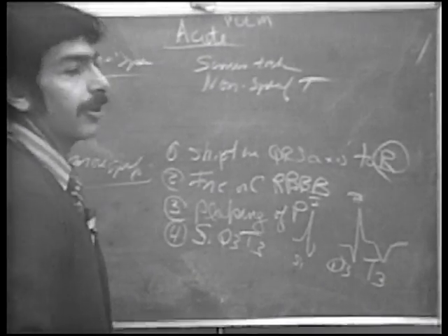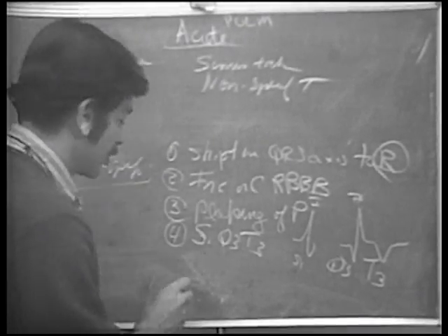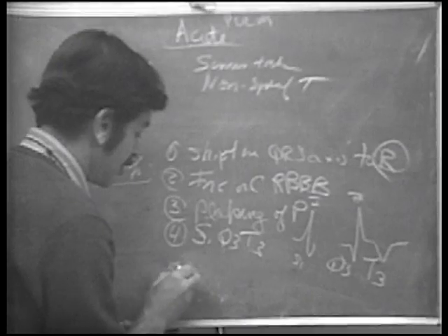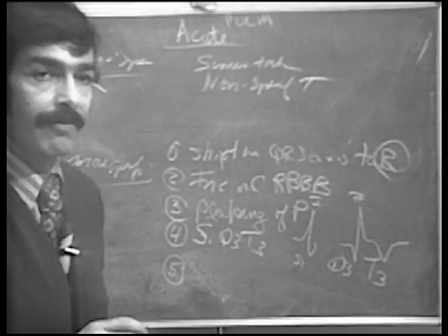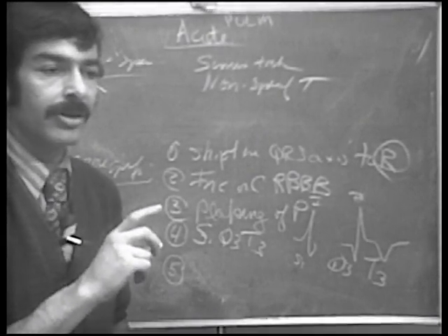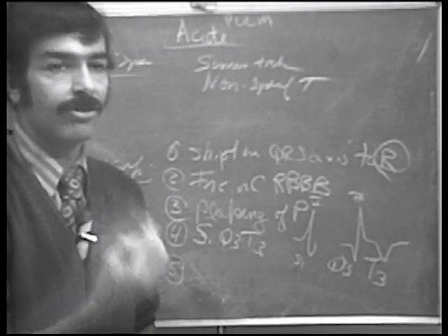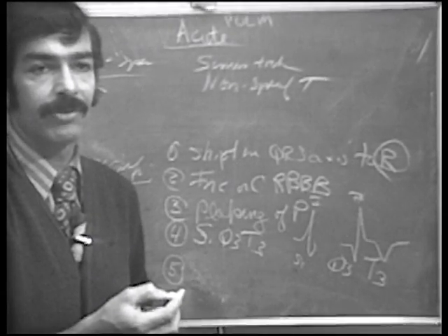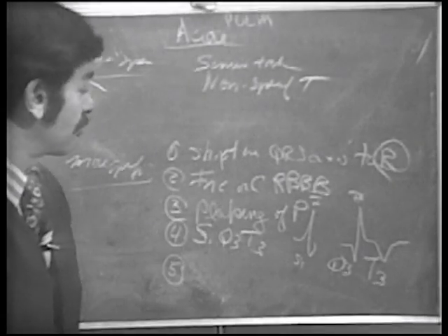What else might you see? There are a couple of other things. I can think of one right now, and that is that you might see T-wave inversion over your right precordial leads. Unless the patient has had pre-existing right ventricular hypertrophy, you don't suddenly develop signs of right ventricular hypertrophy on the electrocardiogram. It takes hypertrophy quite a while to develop, and this is an acute situation.